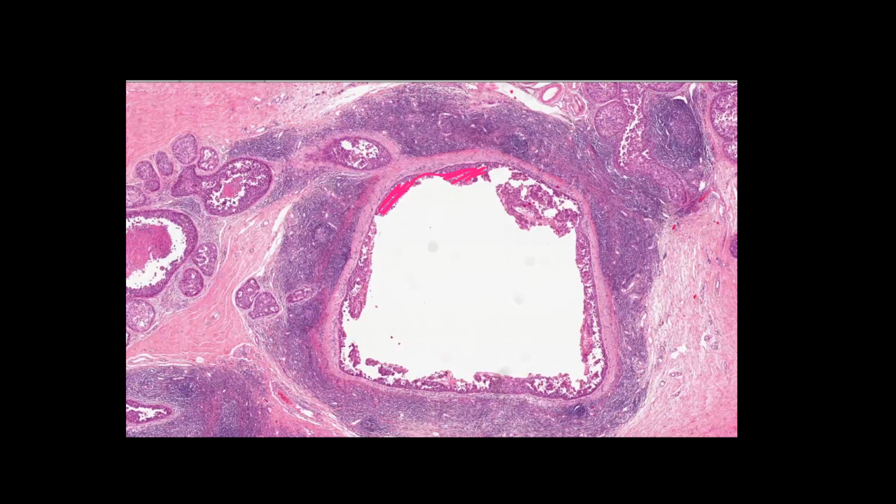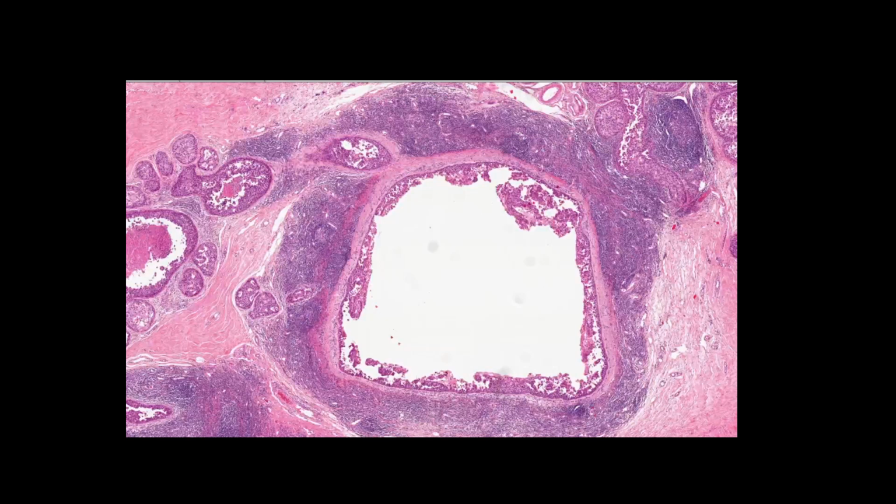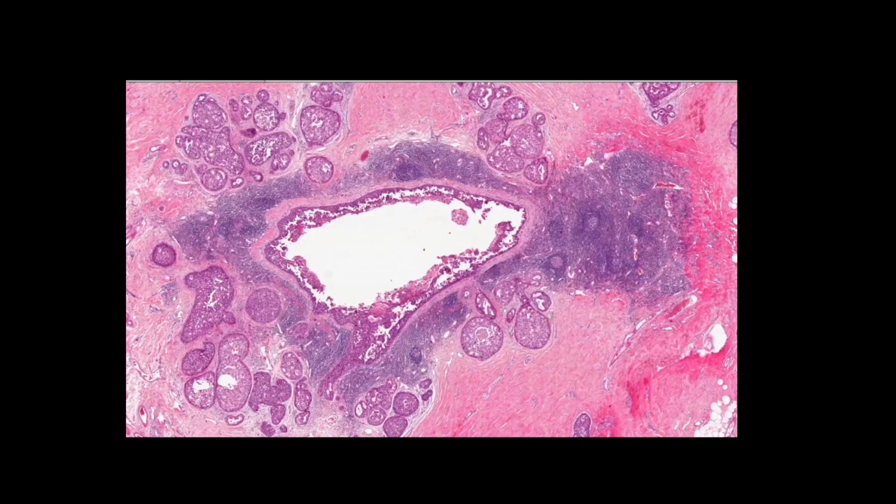Here's the cross-section of another duct-like structure. Cancer cells. There is only a thin layer left because the rest has undergone necrosis. And likewise, here is the thick periductal desmoplastic reaction and an even thicker periductal lymphocytic infiltration with blue color. I'm taking away the color so you can see the original histology again. This is going to be interesting.